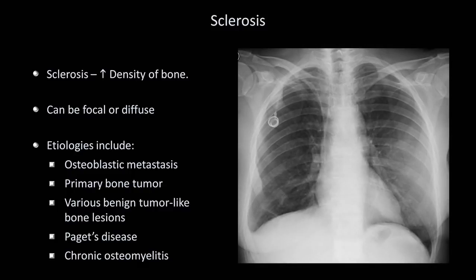Here's an example of a patient with some sclerotic rib lesions. Look closely for them. Don't worry if you can't see them. They're very subtle. In this case, two of the patient's anterolateral ribs appear focally thicker and denser than they should, even when accounting for the superimposed shadows from some of the posterior ones behind them. What's the likely diagnosis here?